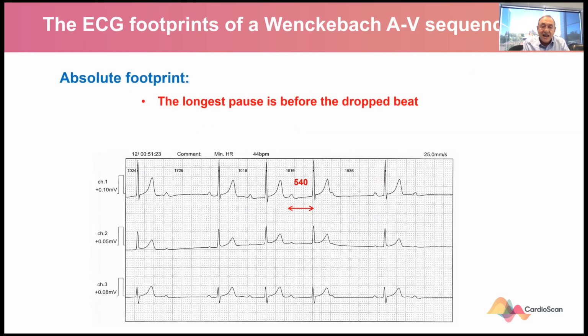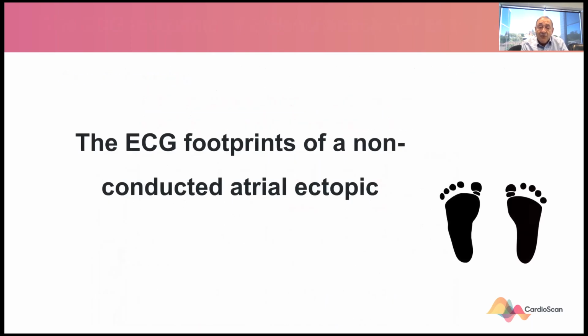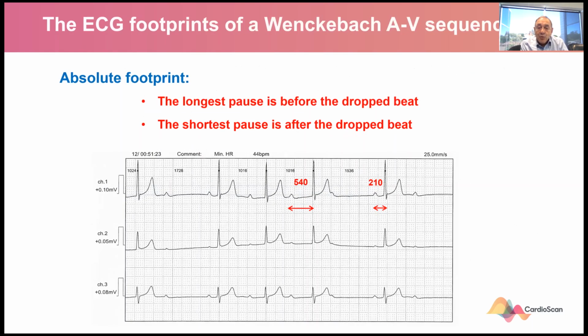I like to say that there is an absolute footprint with Wenckebach AV sequences. That is, the longest pause is before the drop beat, then the shortest pause is after the drop beat, and therefore we can now see that the 3 things we look for are the longest PR interval and the shortest PR interval.